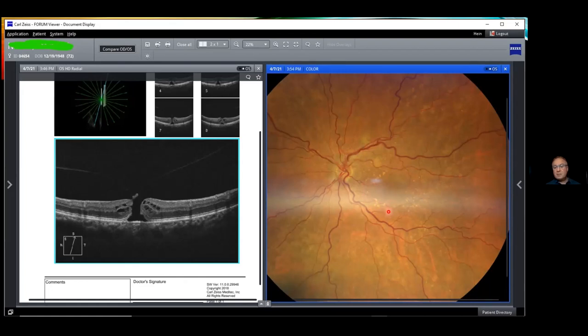you know, if you miss a macular hole looking at that, I wouldn't be too cross, but if you do an OCT, you can see a stage 2 macular hole with the piece of retina still attached to one of the sides of the retina, but the other one freestanding.